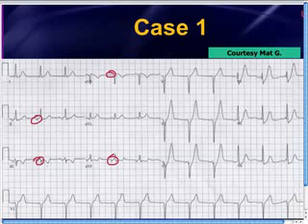Okay? What are you going to do with that? Nothing. But I figured it's worth mentioning when you see these inverted P waves. Think about an ectopic atrial rhythm if they have a normal PR. If they have a short PR, you're going to think of junctional rhythm. Anyway, we're getting off the topic, so let's get back to the 12-lead and the chest pain story.